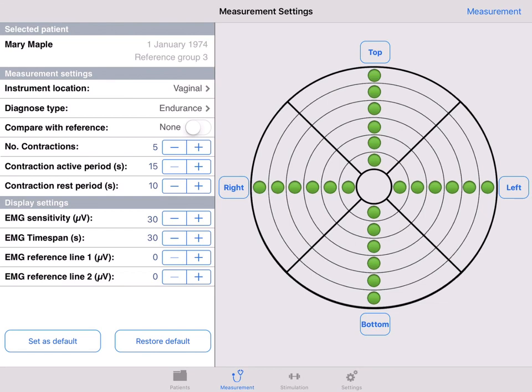The maple grid is showing you the pelvic floor like a tunnel. You see the 4 sides, top, left, bottom and right, and 6 depths. The most outer ring of the grid is most superficial, going more into the circle of the grid, the deeper into the pelvic floor. The 24 points correspond with the 24 electrodes of the maple probe.